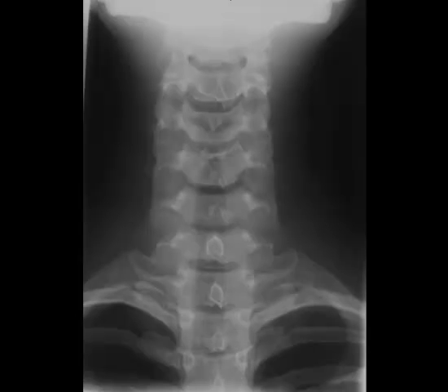We are now going to move on to the AP cervical projection, which demonstrates the lower cervical vertebrae in the frontal plane very well. Let's start by identifying the vertebral bodies. Since there's a lordosis in the cervical spine, on the AP projection, the vertebral bodies do not look exactly square, but are still very well visualized. Here's your superior end plate and your inferior end plate. Next vertebrae down, and so on and so forth.